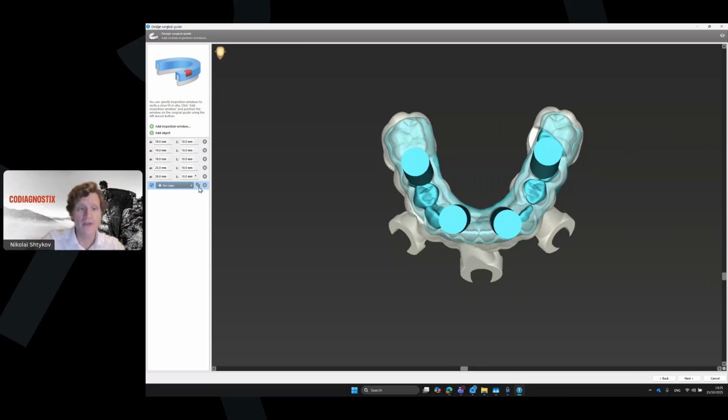And important thing here, so first of all, you click here, not integrate, subtract, offset. You don't need to use any offset. It's also important because you put the offset before, and now you have to use the same STL file. And if you put some offset here, you will increase it, and your prosthetic inside will not fit really well.